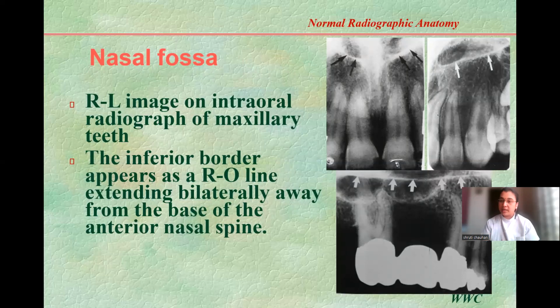ठीक है? Again, thinking in terms of radiology, उस nasal fossa पर अब मैं एक X-ray beam डालूंगी, तो मुझे X-ray पे कैसा दिखेगा? I will see a white and then in between I will see a black triangle. That is the nasal fossa. Same thing over here because I'm taking a periapical radiograph. तो यहाँ पर आपको एकदम ब्लैक एंड एकदम व्हाइट नहीं दिखेगा. We are talking in terms of shades of black and white, and black का या फिर greyness.